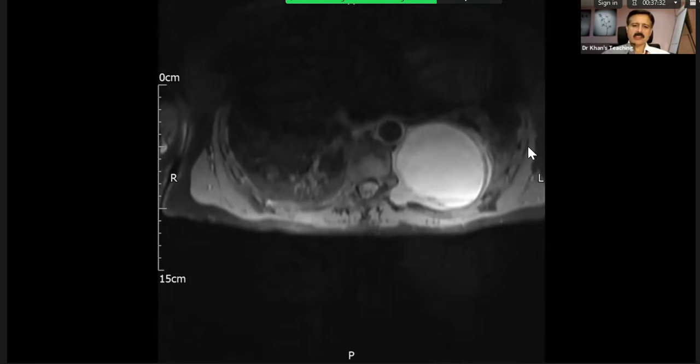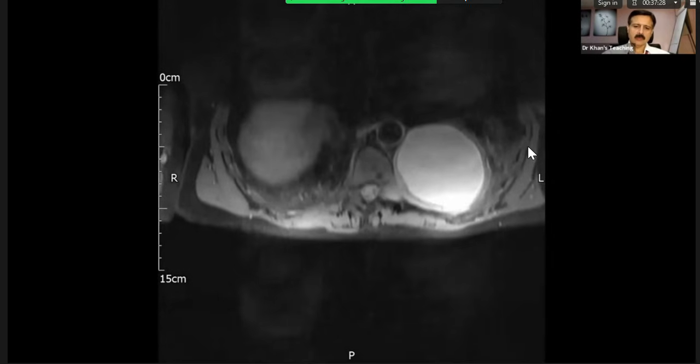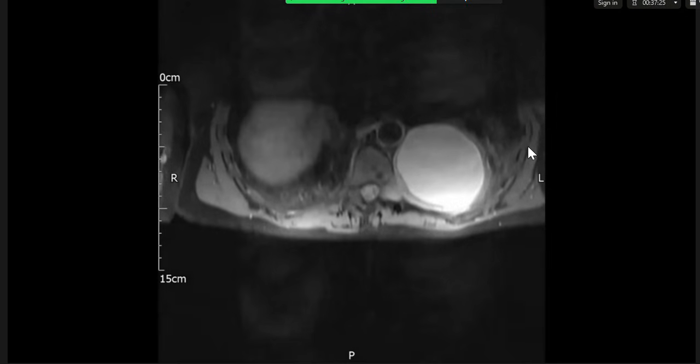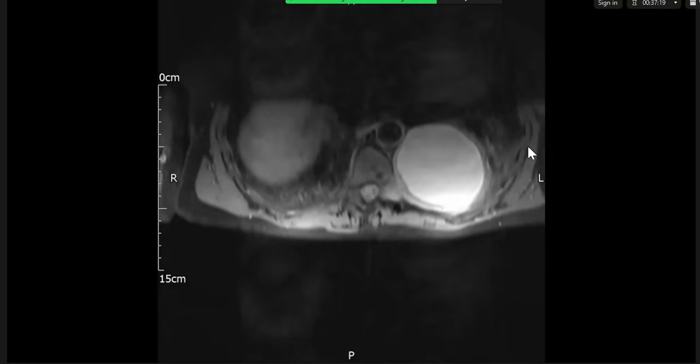So what series is this one? Just stop here, please. Name the series. What sequence? So the fluid is hyperintense, but not as much as the T2. I wonder whether this is a PD.